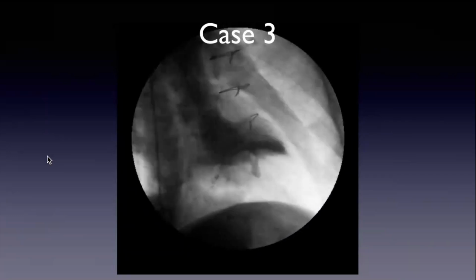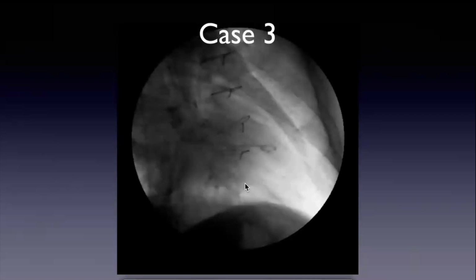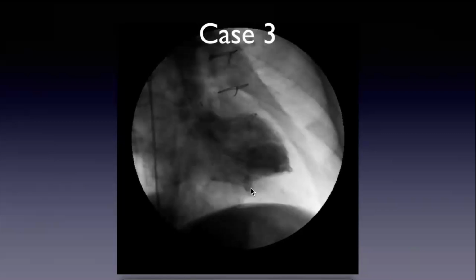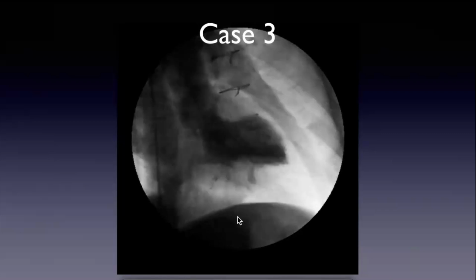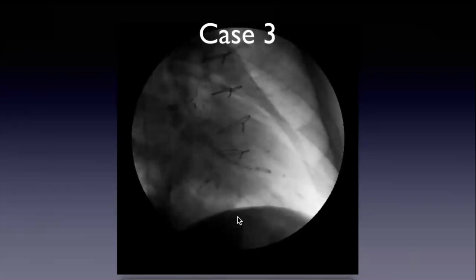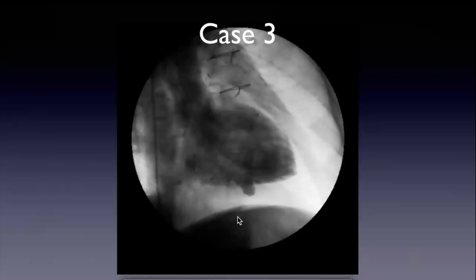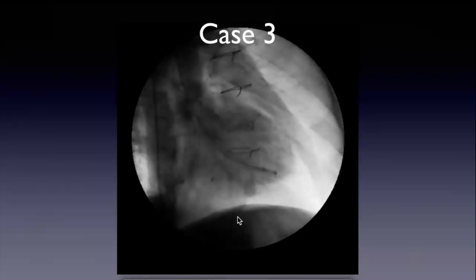It's directly into the apex, and you can see the diverticulum here in the inferolateral wall. And on top of that, you can actually see it contract. You see how it contracts, so pseudoaneurysms don't contract, right? So the focal aspect of it, etc. So this is an outpouching.